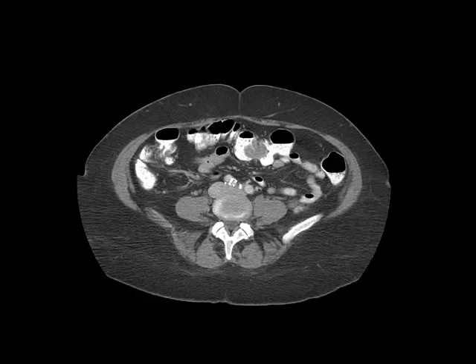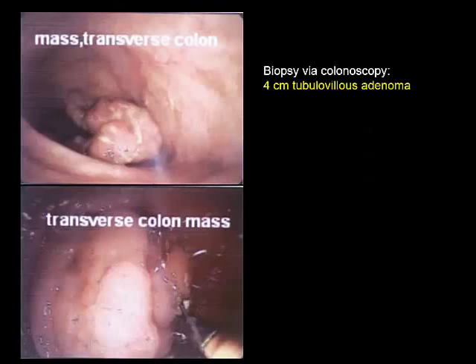This is a diagnostic CT in this same patient that was read as normal in the abdomen, but in retrospect we can see that there is quite a large polypoid intraluminal filling defect in the transverse colon. CT scanning is not very good at detecting colonic wall lesions because of the intraluminal debris and things like that. We're just not very good about seeing these lesions inside the colon.